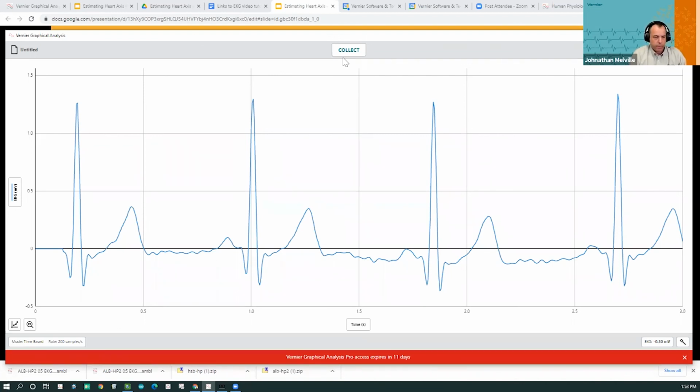Some of our EKG tabs that I've used before have been around for years. They do degrade over time, so don't expect them to work perfectly if they're several years old, but it's really affordable to have the EKG tabs that we have, and other EKG tabs will work great. Other questions?